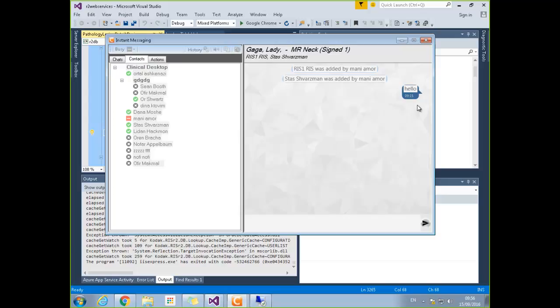Just out of curiosity, I'm not sure we would want that since it's a professional chatting tool, but is it possible to mute a specific person or a group? Because I'm thinking about radiologists, some of them may be antisocial or they don't like to be disturbed. Someone says come on, everyone else has lunch. That's what I'm thinking about. Do we want to have that? I'm not sure, because people always behave in a way.